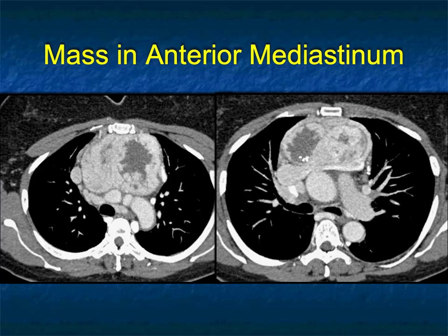The patient has a mass in the anterior mediastinum. It's hypervascular, somewhat cystic, and large. Now, I'm not showing you the images from the neck down. If you had the images in the neck, it would be helpful to look: did this arise from the thyroid gland or not? Usually you can see continuity. You could say other things: lymphoma, though it's a bit vascular; teratoma, that can be vascular and have calcifications in cystic regions, so that's a possibility.